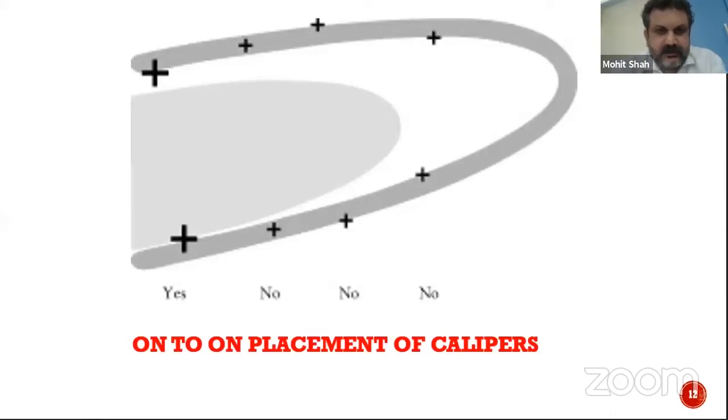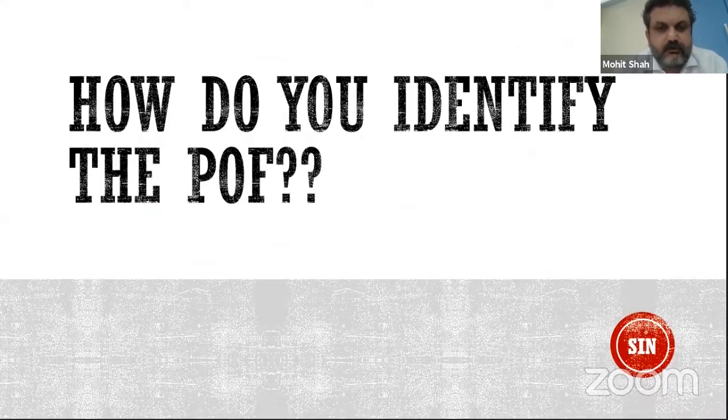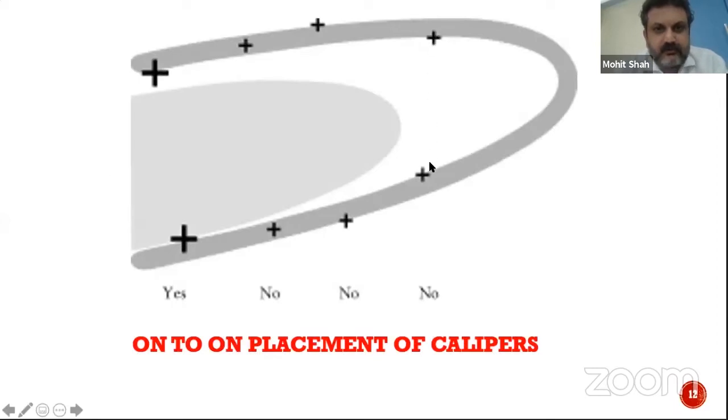Yeah, that's the correct way. On the medial and on the lateral wall of the atrium is a correct way to go. And that is one of the reasons why you need a good zoomed image. If you do not zoom it properly, your caliper placement may not be accurate. And if you're dealing with a cutoff of 10 millimeters, that's a very narrow margin to play with. I think that should be good, Meenu.